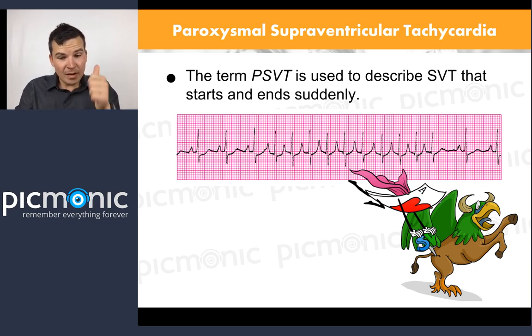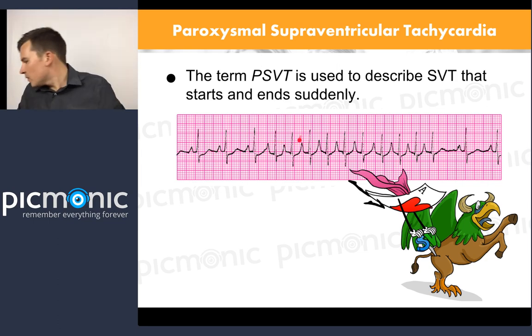Well, I'm going to get my beautiful thumbs, and I put them up there, and I look, and I'm like, wow, I got a big space. There's my red pointer. I got a big space. I got another space the same. Then it gets smaller, but then it's just literally just tiny space.